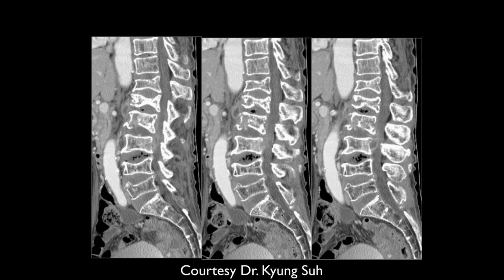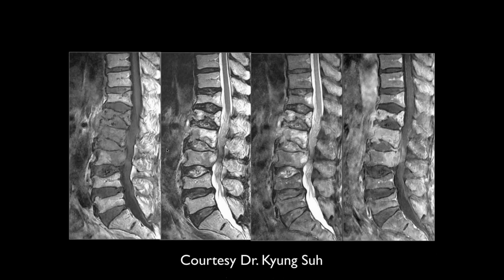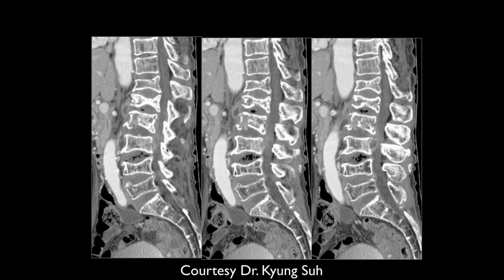CT, multiple levels collapsing vertebral bodies. So what do you think is going on here? So multi-level, so TB. Okay, good.